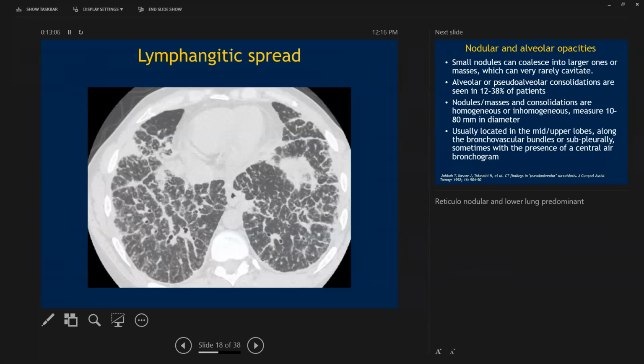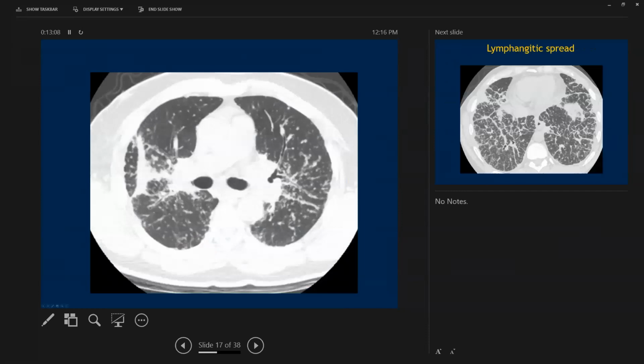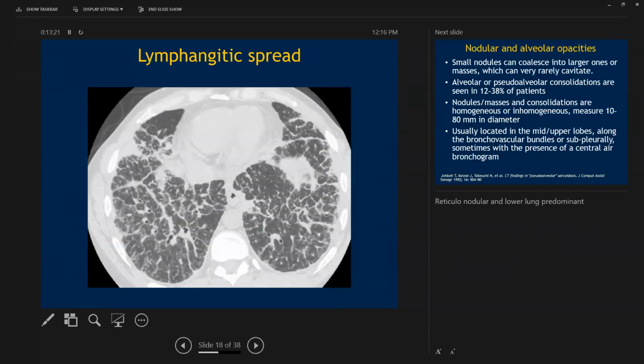Now, if I had bilateral hilar lymph nodes, as in this case, subcarinal node, and if I were to find out the patient was either from Africa or was of that descent, then I would be considering sarcoid. Now, in something like this, I would probably not put sarcoid as my first differential consideration, purely because of the distribution and just the fact that I'm seeing much more lines than just nodule. But even here, you see the sort of beaded interlobular septum.